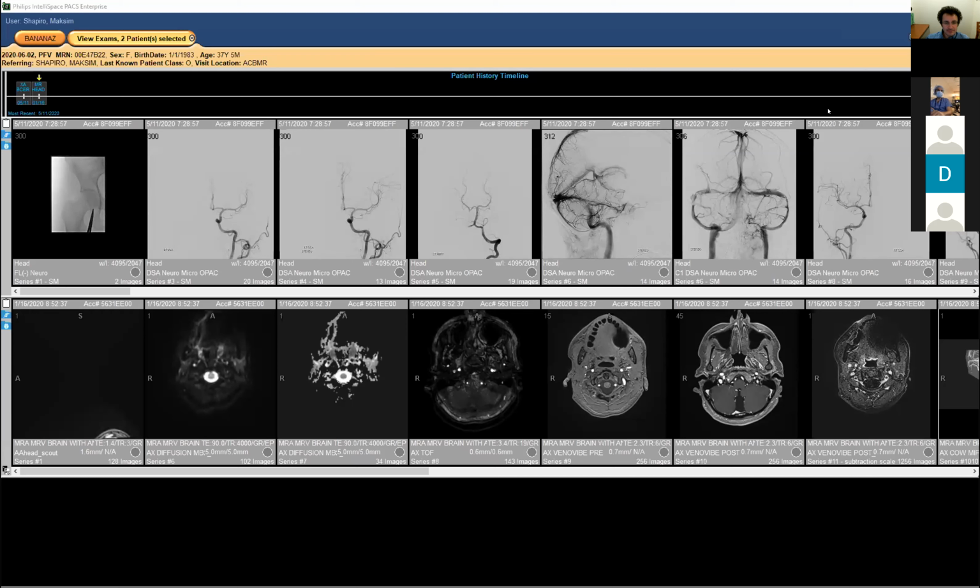It's kind of a straight and flat vessel, and an atypical connection of a basal venous segment to a tentorial venous structure instead of the vein of Galen.